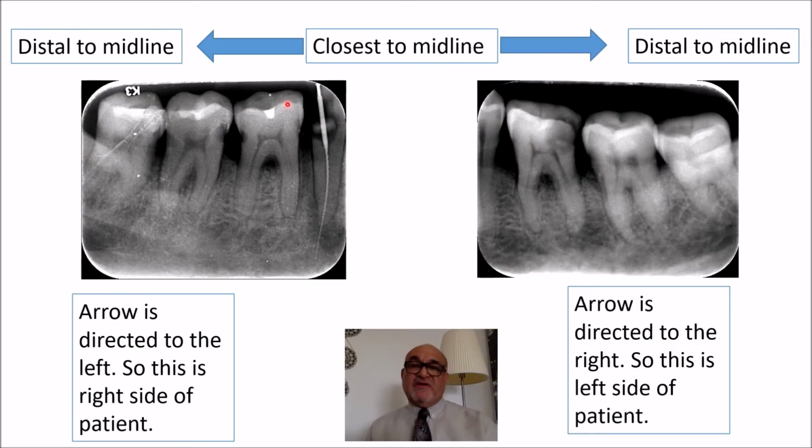Another radiograph over here, which is again for the same patient but for different areas. Midline, of course. Both of them are mandible because of the trabecules. As you can see, trabecules and the inferior dental canal over here, the inferior dental canal over here. Okay, now 5, 6, 7, 8.